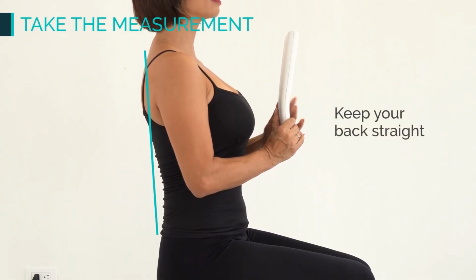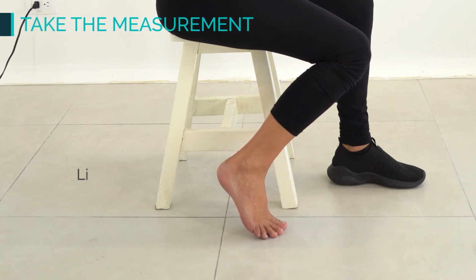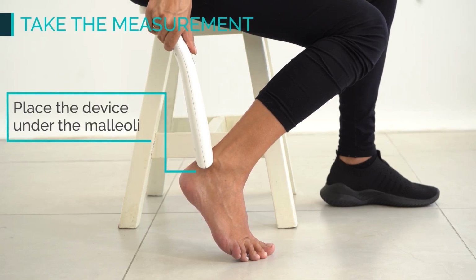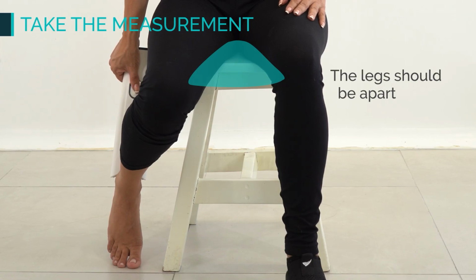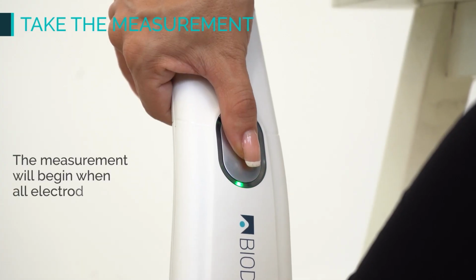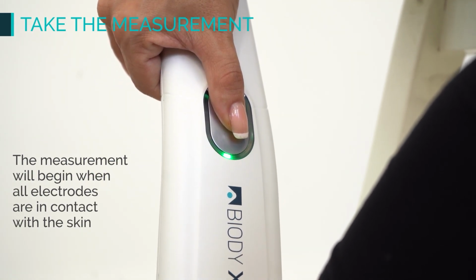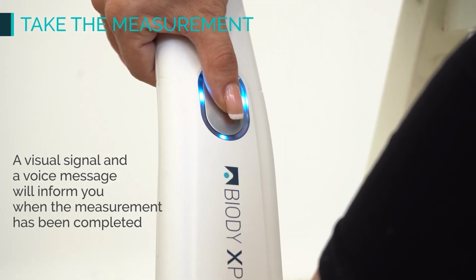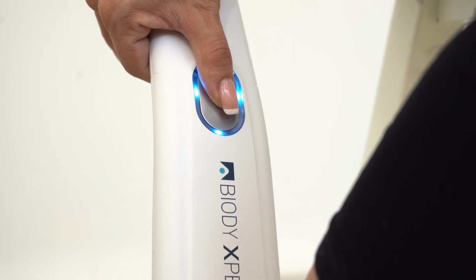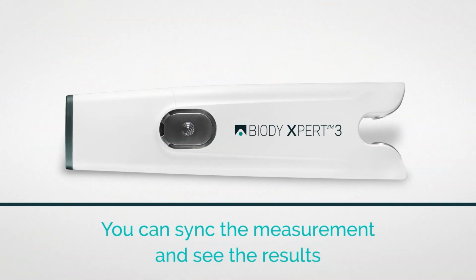Keep your back straight during the measurement. Bend your leg and lift your heel. Position the device under your malleoli. Make sure your legs are spread apart. Don't move anymore. The measurement is going to start. The measurement is finished. Bluetooth communication enabled. You can now sync the measurement and see the results.